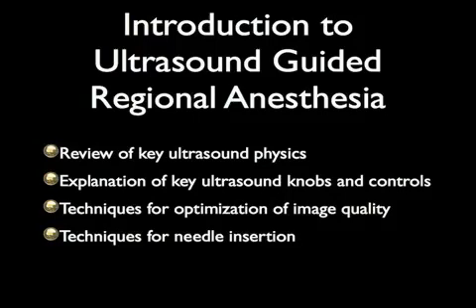Welcome to Introduction to Ultrasound Guided Regional Anesthesia. In this video, we will review key aspects of ultrasound physics. There will be an explanation of the key ultrasound knobs and controls. We will describe techniques for optimization of image quality and techniques for needle insertion.